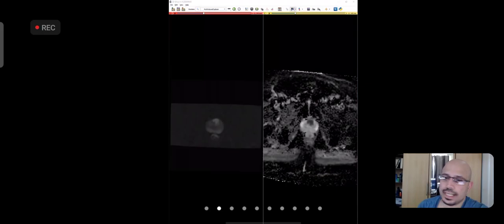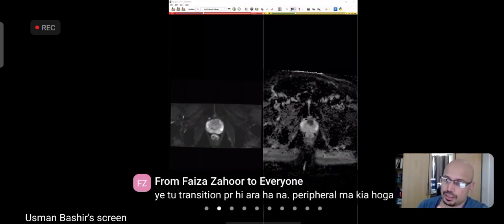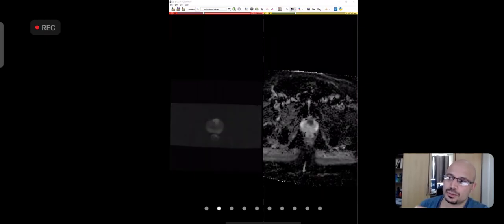Oh, actually, yeah, I'm not going to go into too much detail. Actually, this is brighter, okay, than this. नजर ये bright आ रहा है, लेकिन ये actually brighter है. हमने slope में देखा इसकी value 450 है, और इधर इसकी value 300. लेकिन surroundings dark हो गई हैं, तो dynamic range की वजह से ये bright दिख रहा है.